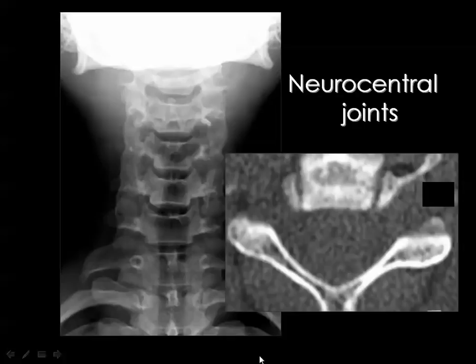In the cervical spine, we have another joint, which is the neurocentral joint, which is the joint between the vertebral bodies. And you see in the cervical spine that there are two elevations on either side of the superior surface of the vertebra, where the vertebra above is articulating with the vertebra below. Then if you have a section in this area like this one, you will see that there is a small bone, then a joint space, which is the neurocentral joint, then a large bone, which is the vertebral body, then another joint, which is the neurocentral joint, and a small bone.